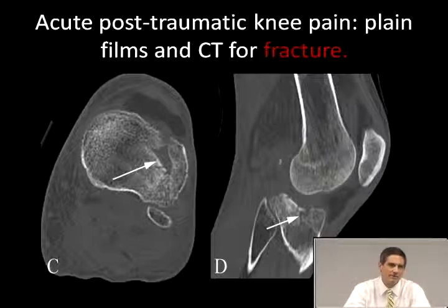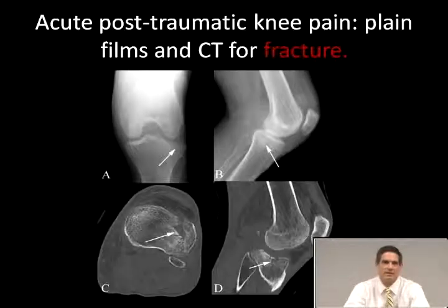They're trying to figure out how many fragments there are, where they are, what's displaced, what's not. This composite picture shows you the fracture, and then the CT, which was ordered by the orthopedic surgeon prior to instrumenting that fracture for repair.